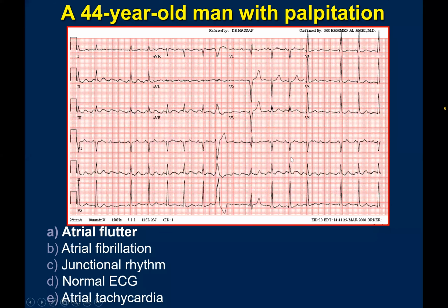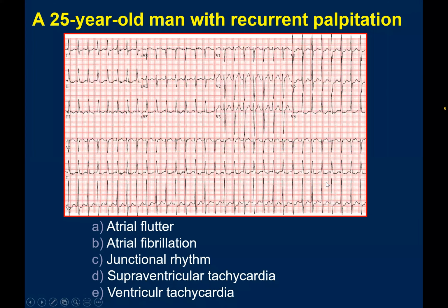The re-entry circuit depends on the location, with the right atrium, left atrium, the usual clockwise or counterclockwise, which is isthmus dependent, or if it is around the scar. So it will look different from lead to lead. It will not look the same on all the leads. Does that answer your question? Yes, yes, doctor. Thank you. You're welcome. So we'll move to the next one.